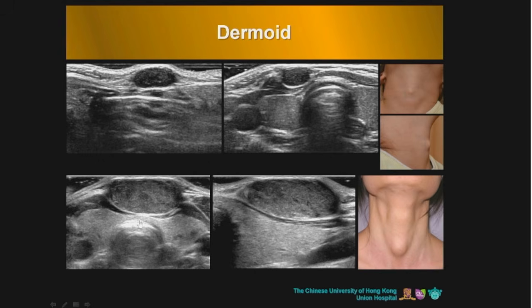Midline masses, like we said, dermoid, epidermoid, ranula. In young patients, usually low down in the neck, just towards the hyoid bone, where you would normally see a thyroglossal duct cyst. The location of a thyroglossal duct cyst is also the location of a dermoid. So how do you separate a thyroglossal duct cyst from a dermoid? Is this a thyroglossal duct cyst? We don't know.